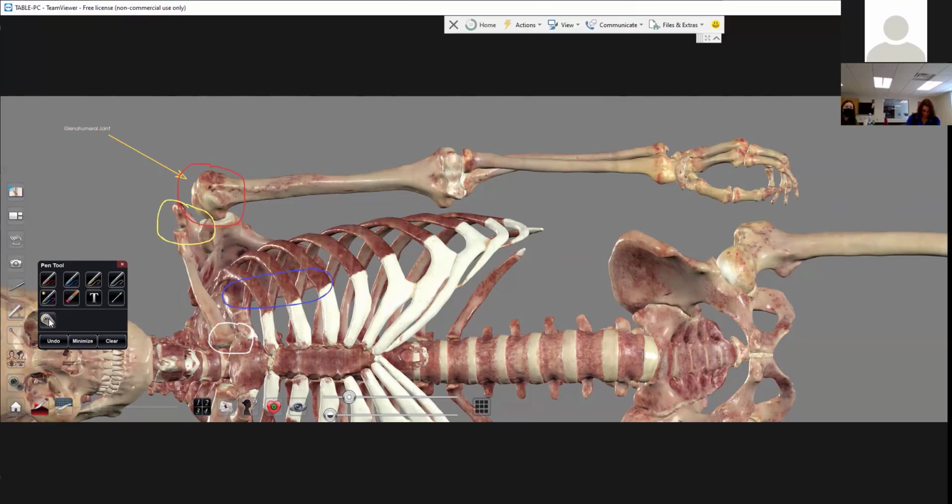If you want to adjust any of that, there is a settings in here where you can change your custom pen, and you can change the size and color of the text as well.